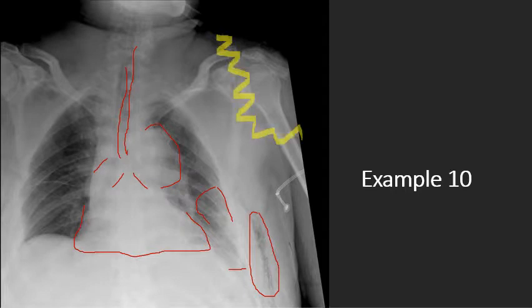This is not normal. This is a chest tube. The chest tubes are supposed to go in here. This chest tube's going like that. This is a malpositioned, misplaced chest tube. You'll notice that they did do the appropriate positioning, but they did not appropriately place it. And this is an error that happens whenever you place it.